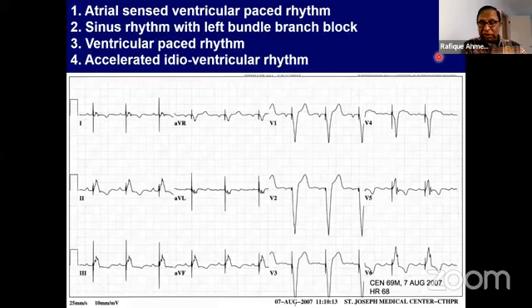Yeah, so the majority answered, and both C and A are correct because it is, of course, a ventricular paced rhythm. But before each QRS pacing spike, there is a P wave with a consistent relation. So you have to describe that.